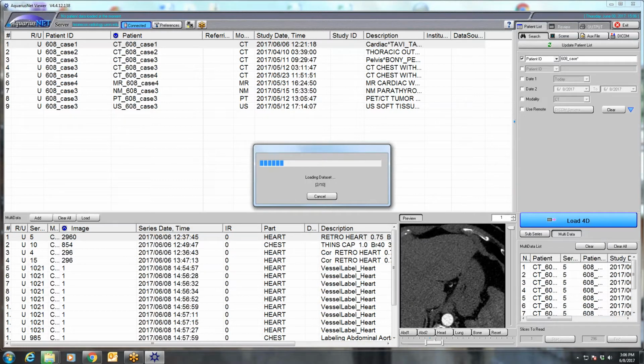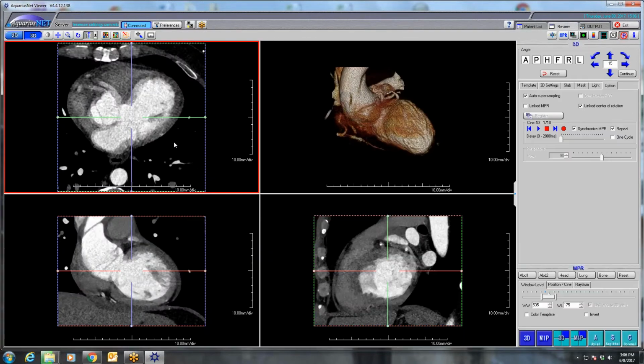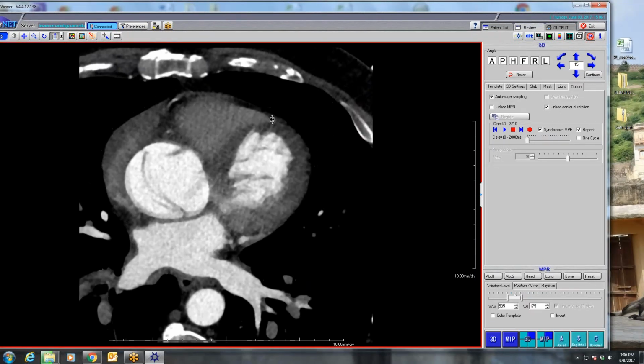So this is a guy who came in with chest pain, shortness of breath, and had a CT at an outside hospital that showed a large dissection. But what's interesting here is the surgeons asked us to scan him for various reasons because they wanted to figure out why he wasn't dead. And I'll show you in a second if this ever opens up. There we go. So not a good study in terms of quality. The guy was throwing PVCs like crazy.